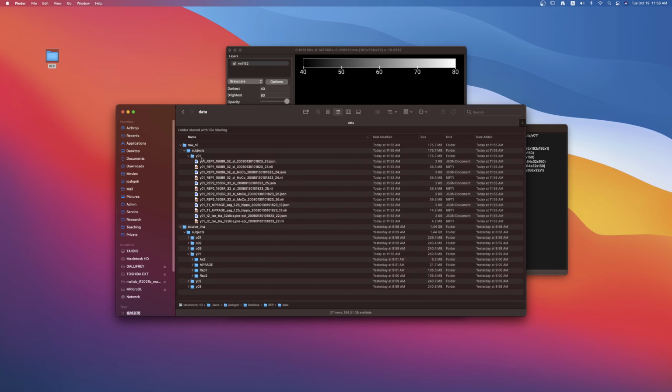In this way, I don't touch the original Dicoms. I create the Nifti from the original Dicoms, but then I move the Nifti to this raw Nifti folder, and from here on, we will operate on these files, so we never disturb the original data. We can go ahead and close these. We don't need to see that, but we will focus on these.